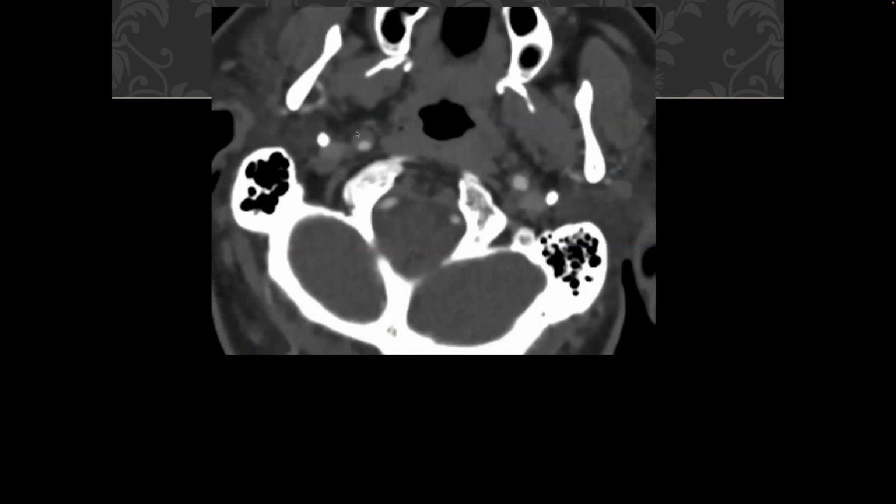Here's another patient. This one you can make the diagnosis of the carotid dissection based on the appearance of the wall of the vessel. Normally you see a thin wall around the vessel with fat around it. This of course is not the carotid wall here, but in this one, this looks like the carotid artery, but it looks like there's something filling a portion of the carotid artery. So again, this is another case of carotid dissection.